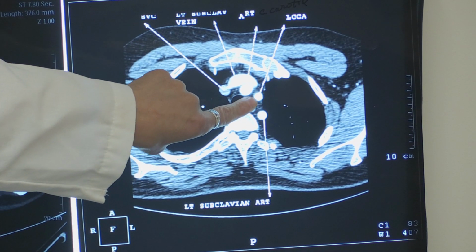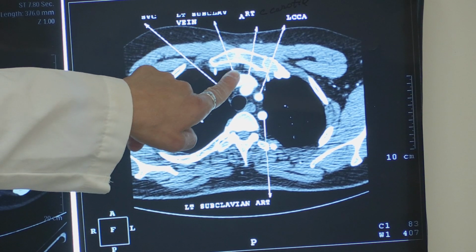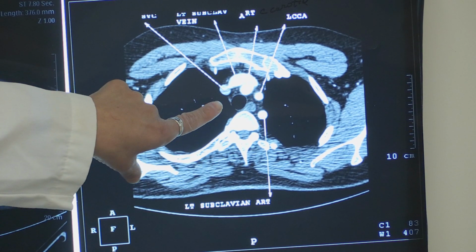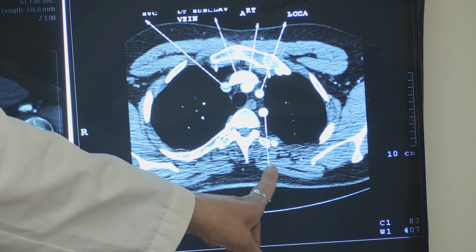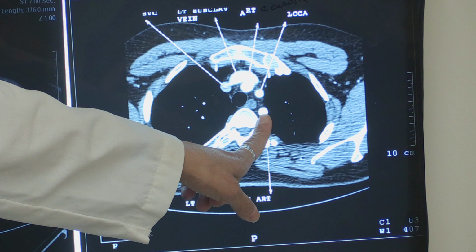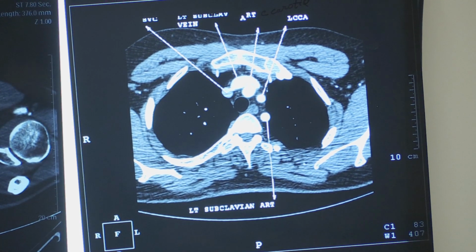You have your left common carotid artery, your left subclavian vein, your left subclavian artery, all the way up there. I'm going to take this down.